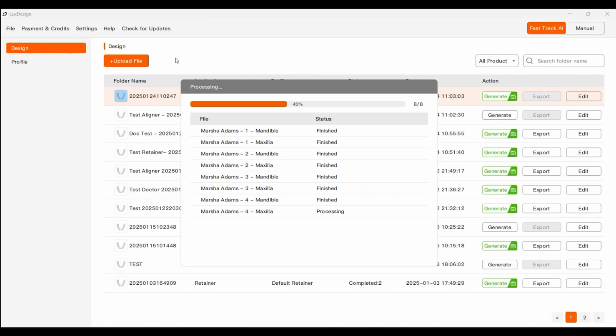And that's really just a matter of choosing the AI engine that allows you to create the trim line that you'd like. And it tells you exactly what trim lines each AI engine allows you to create. For Lux AI, it allows you to only do straight trim lines. Lux AI Pro allows you to do straight, scalloped, and hybrid. It's really up to you. There's no cost difference. It's just what trim line that you prefer.